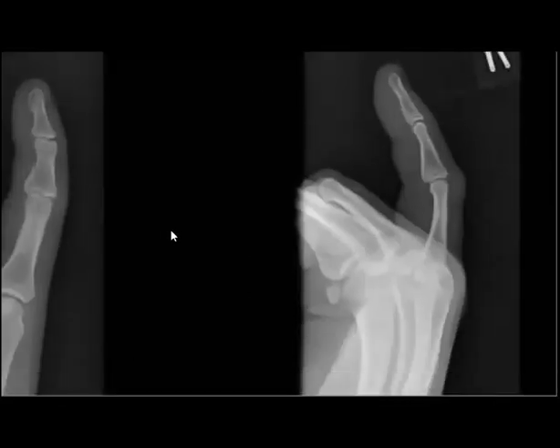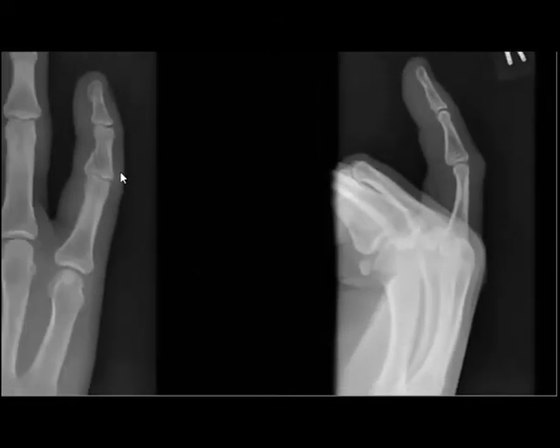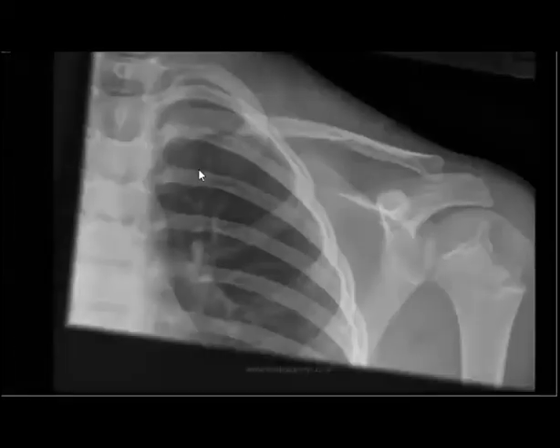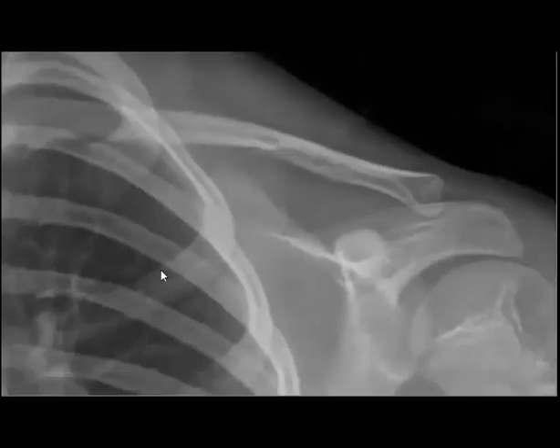Okay, again, check much and much. Sometimes it is subtle in one view. But if you go to the other view, you can see it well. You see the fracture well. You need to zoom until you reach the fracture or the diagnosis. Here, now I think after training, it becomes easy for you to detect. If this slide comes to you as a short or rapid reporting, what will it be.